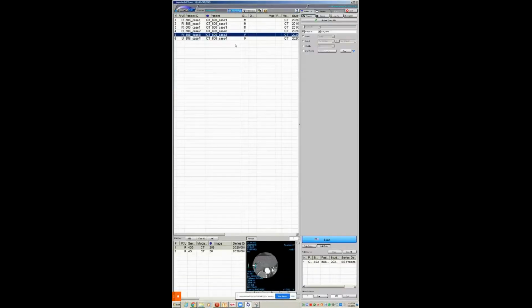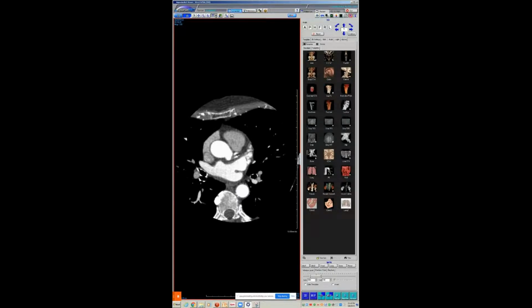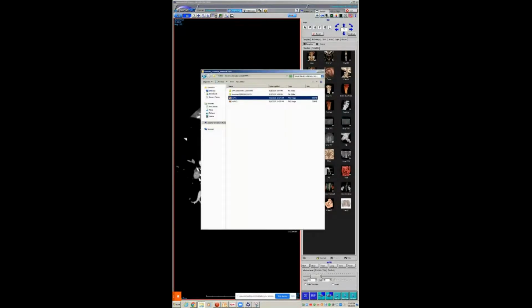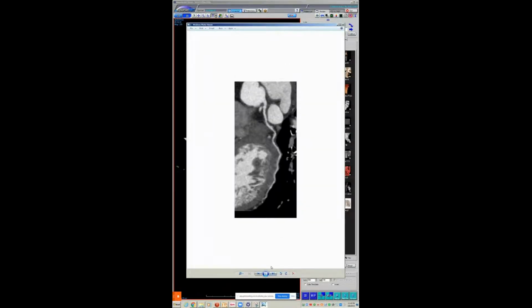And in that same vein, here's another case where I'll just show the recons for the sake of time. This patient had a stenosis, and we can debate what people would call it, but to me, that's going down the barrel of it.